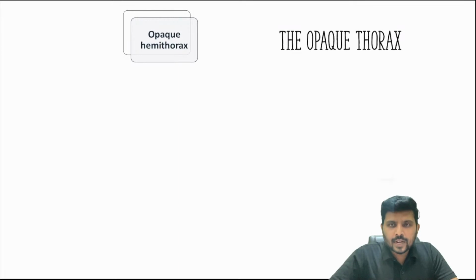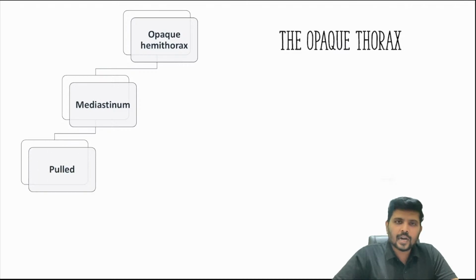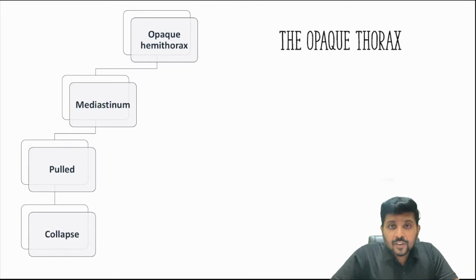So opaque thorax is basically, opaque means what? White out lung. I repeat, opaque means what? White out lung. Whenever you get this opaque hemithorax, you need to see whether the mediastinum is pulled or pushed. If the mediastinum is pulled, it means it is collapsed. That is, your alveolar air is replaced by nothing else, as a result of which alveoli will get compressed.